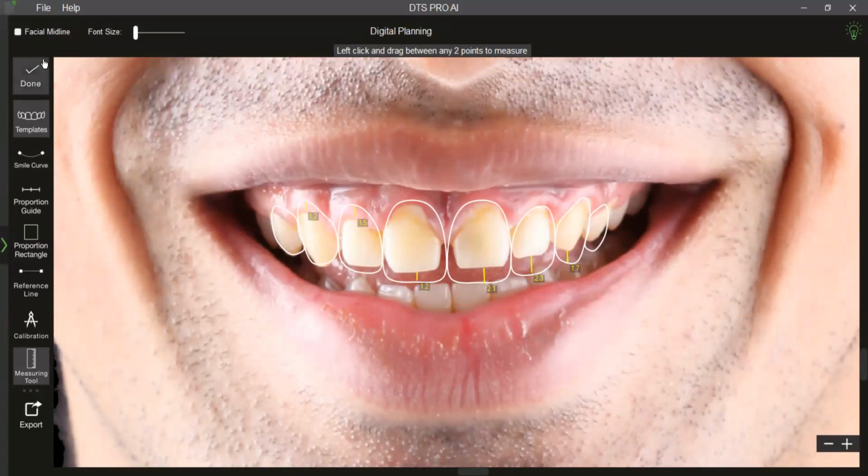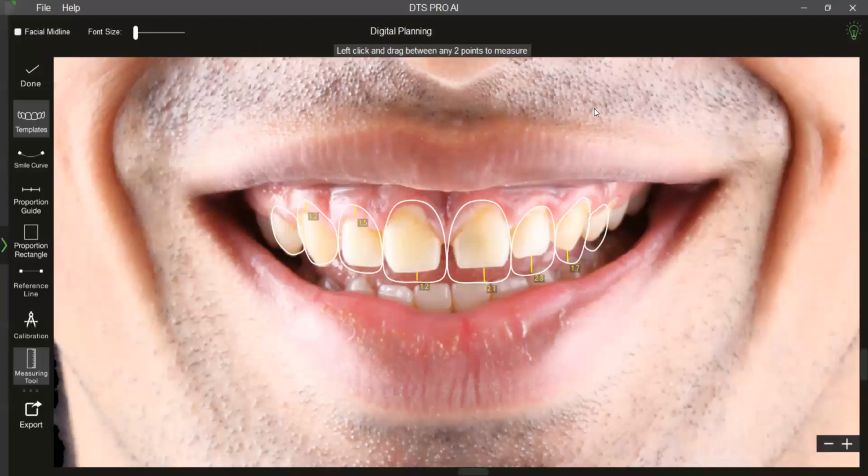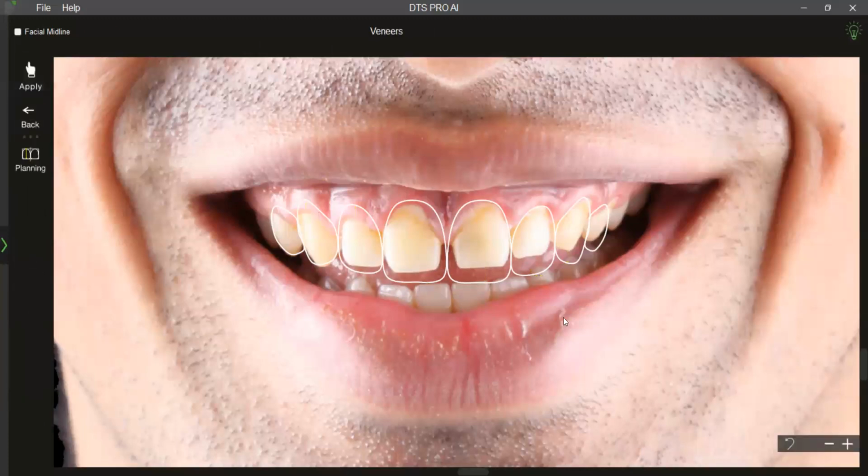So this was a little bit of light about DTS planning. Of course, if you have any doubts or any questions or need a little more training on the digital smile designing, you can reach out to us on email, and we shall definitely set up a one-on-one session with you in case you need any hand holding on this further. Of course, there are simple videos on each screen which can help you navigate through the functionality of that particular screen. So for now, this is about digital smile planning.